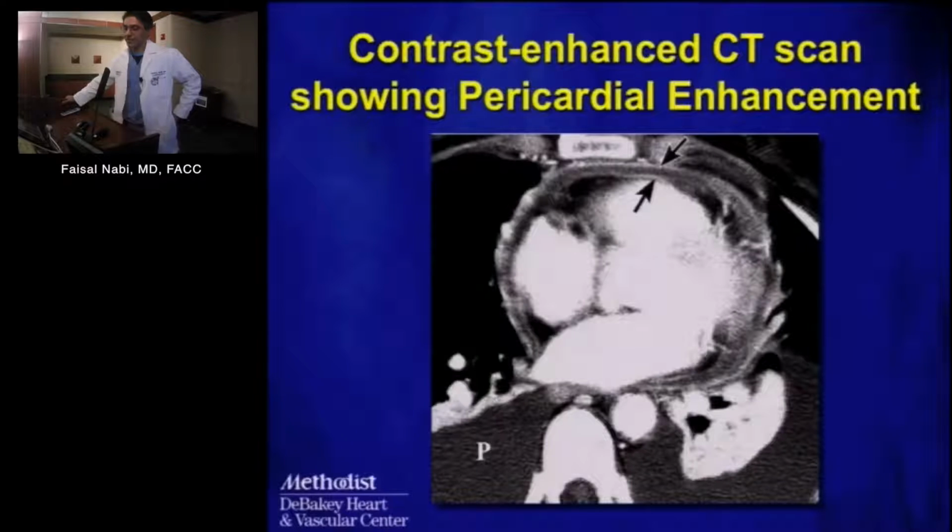I put this in there because it's in the literature, and I'm hoping to get a slide of my own one day. This is what delayed hyperenhancement of the pericardium would look like, where you can see there is definitely some uptake of contrast within the thickened pericardium.